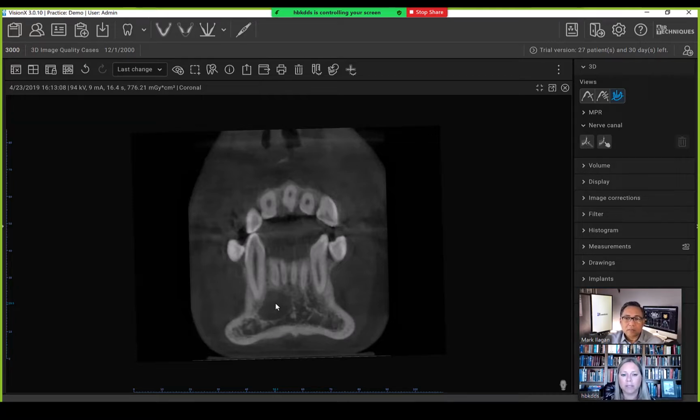We would write up any of the teeth that we saw, the periapical lesions. I do some custom sections with my software, and so especially with the teeth, I'll split out your mesial buccal roots, your distal buccal, and your palatal roots, so you can see the lesions at the apices of each one and the relationship to the inferior aspect of the maxillary sinus.